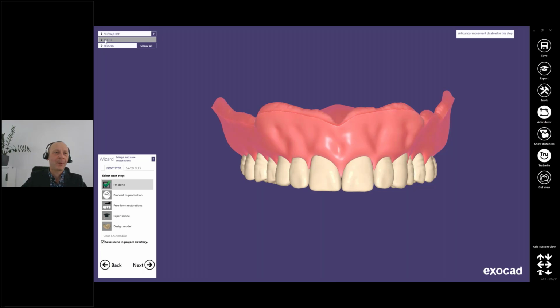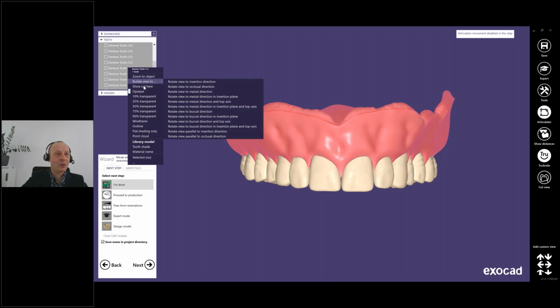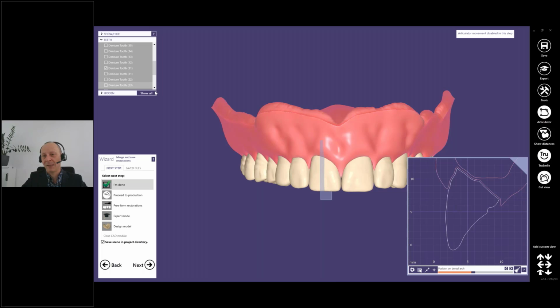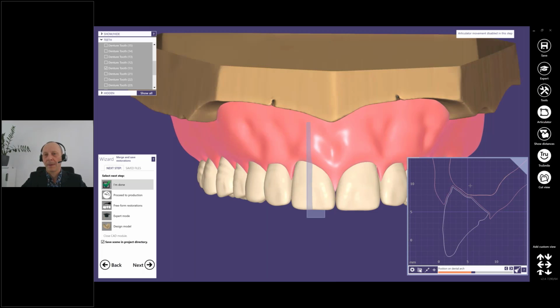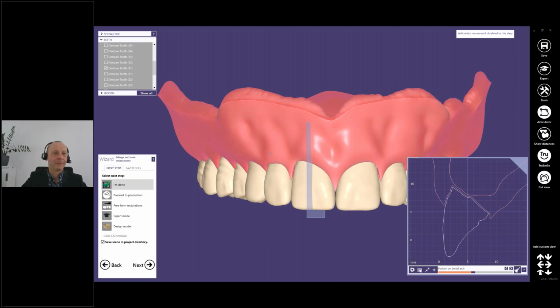So, cut view, where? On which position? Somewhere. Okay, anteriors maybe. I can click here, right mouse click, context menu, show cut here. This is cut view, yes. Okay, these model teeth are trimmed to the base, yes. That's fine. Only to show the cut view once again.